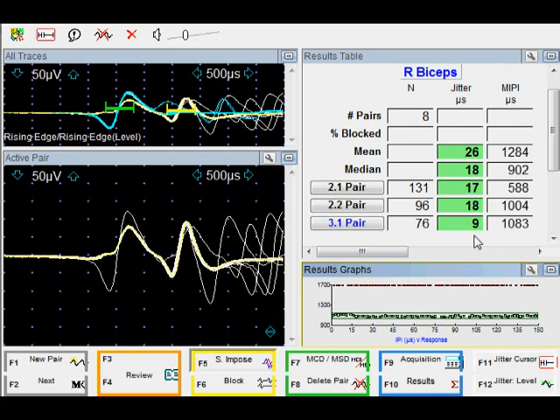If we get blocking, it's most likely a technical problem, and therefore the system has automatically thrown out all the traces that crossed only one window. Those are the blue traces that you can see over here. They cross only one window, but did not cross the second window. So this is one way the system will automatically get rid of missed triggers when the jitter is normal.